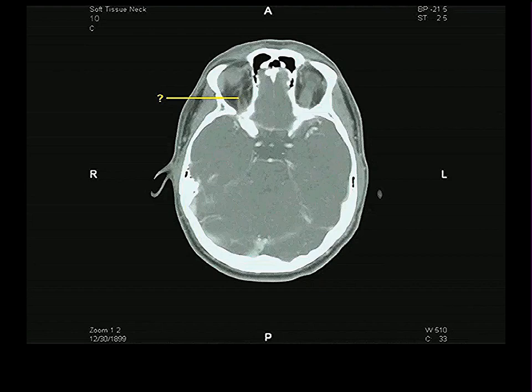In fact, this is something that's running mainly anteroposteriorly, not so much mediolaterally. It's crossing the optic nerve because the optic nerve is obliquely positioned.